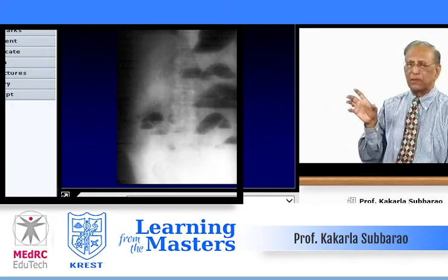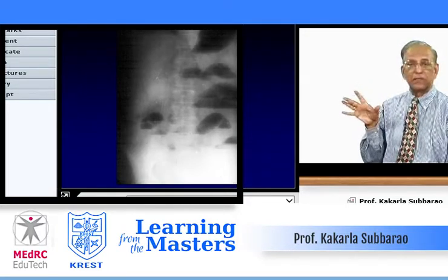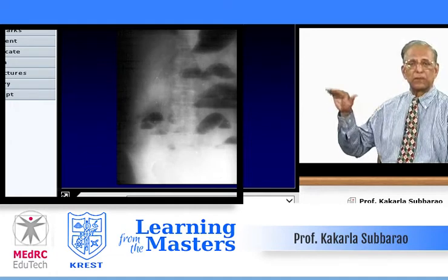But then look at the cecum, it's markedly distended. If the ileocecal valve is competent, the cecum gets distended and may get perforation also. If it is incompetent, then most of the gas is deflated from the cecum and colon, and goes into the small bowel.